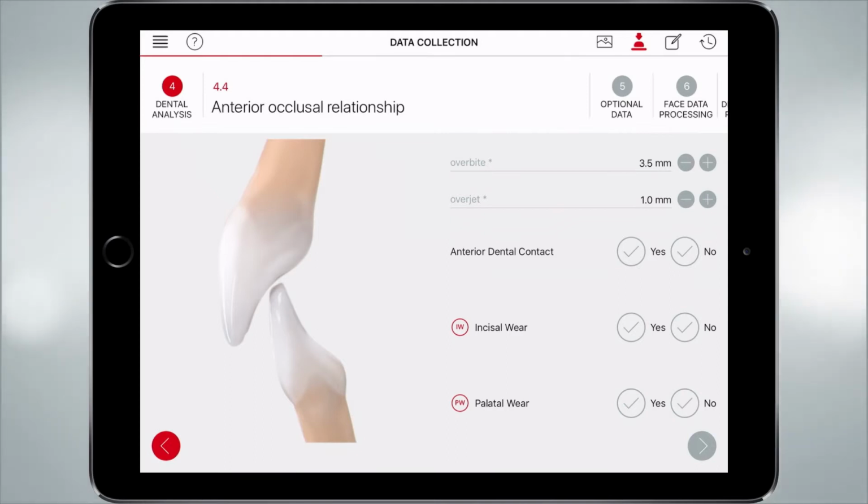So at this point, if the total amount from buccal to buccal, upper to lower, remains 5 millimeters, for example, the real one is much shorter, much narrower, like 1 millimeter, like in this case. So the occlusal and functional overjet has to be measured from the lingual part of the upper teeth and the buccal part of the lower teeth.